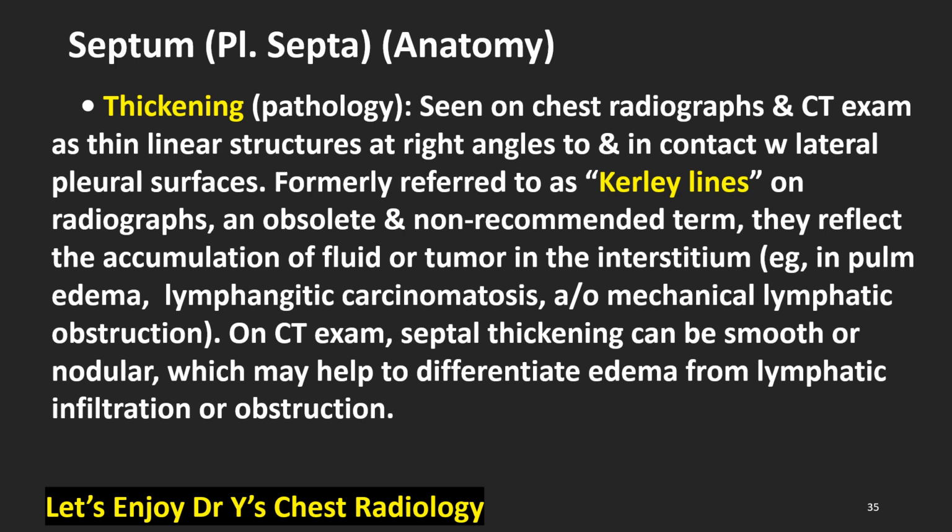On CT exam, septal thickening can be smooth or nodular, which may help differentiate edema from lymphatic infiltration or obstruction.